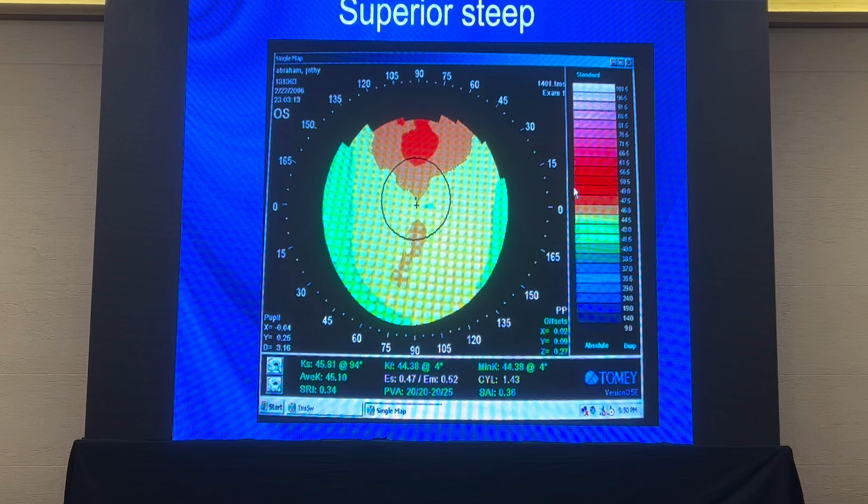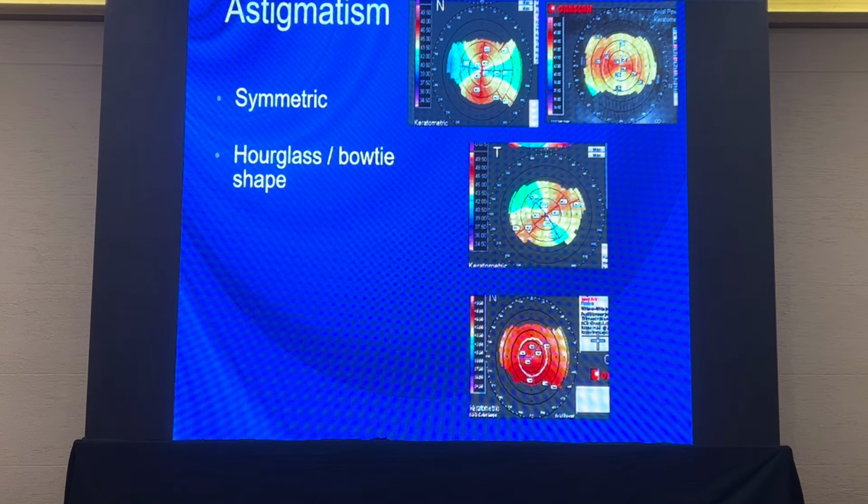So in such a scenario, if you want to see whether it is normal or not, you have to look at the points at two inferior, superior. That point should be seen around 3 millimeter from the central fixation point. You should see the topographic value. Keep the cursor over there on top as well as bottom, and if the difference is more than say 1.8, it is a red flag.